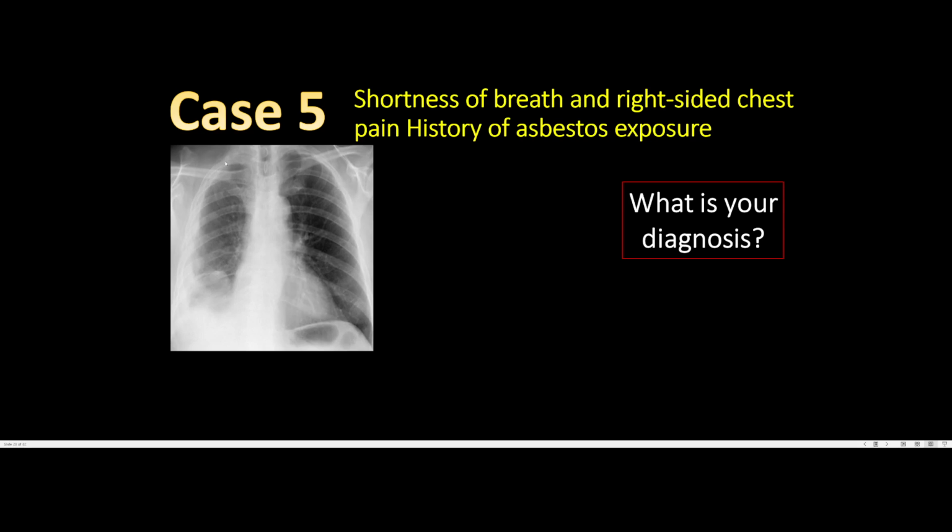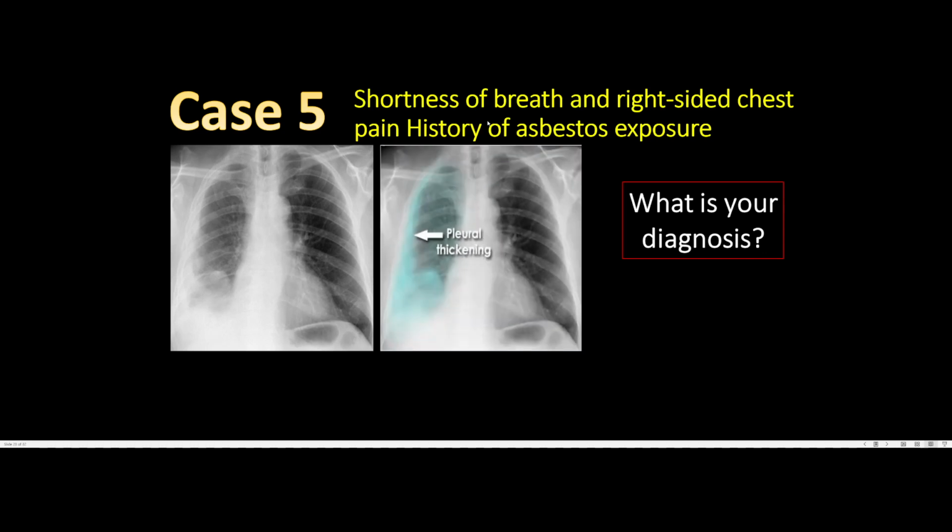Compare the left side to the right side, and you can see there's some thickening of the pleura, suggesting there is growth here. So there's thickening of the pleura, and there is a loculated mass as compared to the other side. And you can see that this portion of the lung has more lung volume as compared to the right. So this finding, in combination with this patient's history, you're thinking again a pleural malignancy or mesothelioma. All right. Of course, just remember that you don't always stop at the obvious finding. Whenever you're reviewing a chest x-ray, you want to look for other abnormal findings.